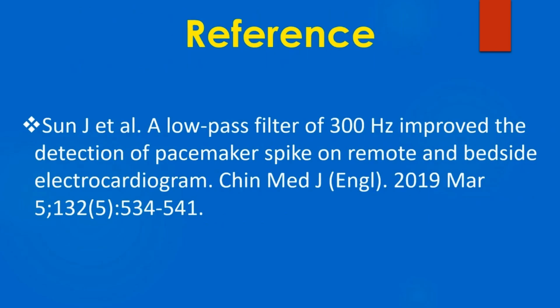Here is a reference on the importance of low-pass filter setting in detecting pacemaker spike.